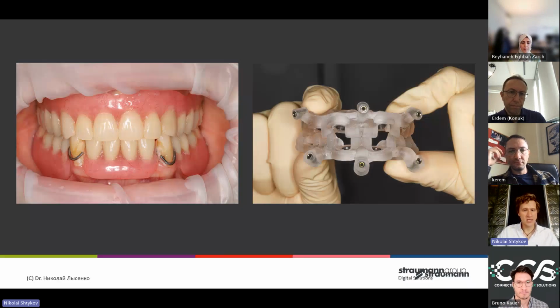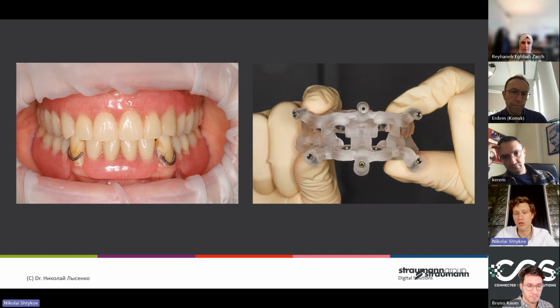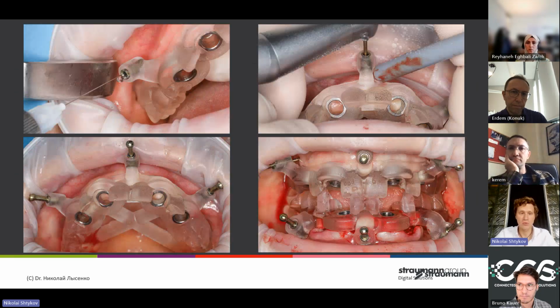Okay, guide design. One type of guide design for surgical guides is not stackable guides. CoDiagnostiX has a function to combine the STL file and your guide design. This guide is designed like prosthetics, but with sleeves.